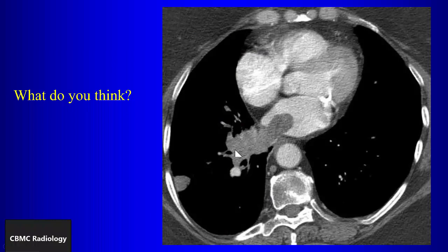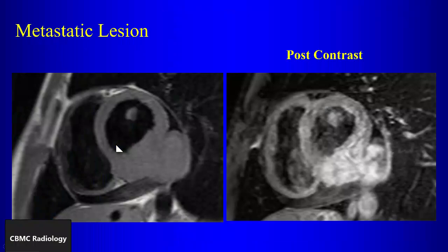So lung masses can invade into the left atrium, so if you have a mass in the left atrium, one thing to consider, again, they might see the mass with echocardiography, but they're not going to see the lung mass. But lung mass can invade into the left atrium by growing through or around the pulmonary vein. So this is lung cancer invading into the left atrium by growing through the pulmonary vein. Okay?